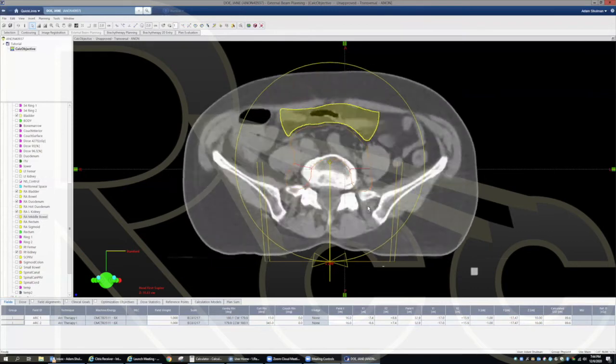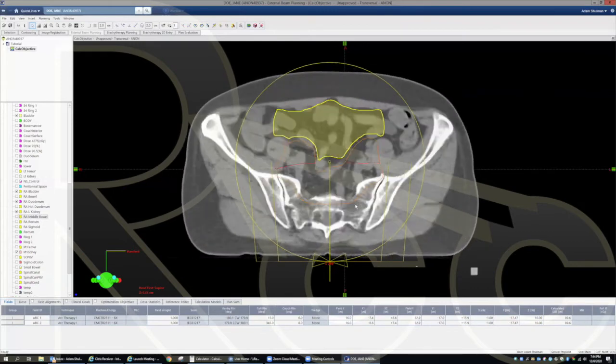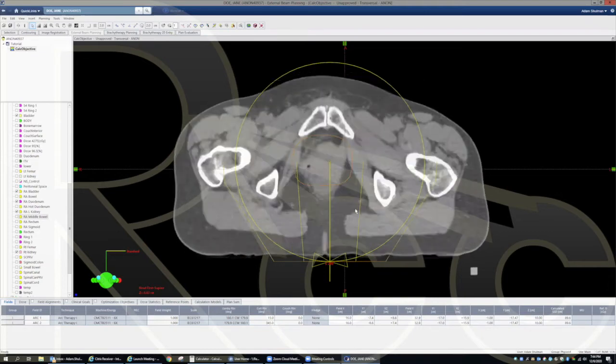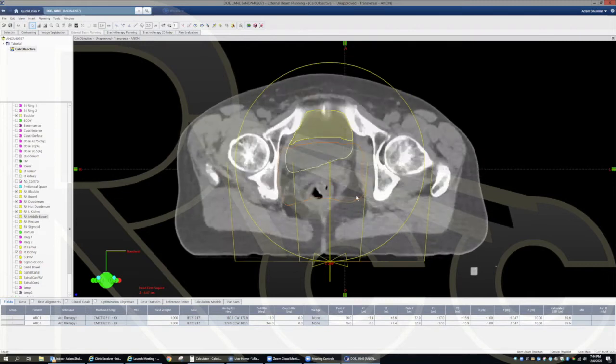The way that I'm going to show you how I plan is I'll look at my DVH constraints and see what I need to achieve, and I'll make sure that I achieve that. If there are areas of overlap or things that I can't achieve, I'll make note of that. But if I reach tolerance, I don't just stop there. What you'll see is I'll push as much as the optimizer will allow me to push. Even in this case, it's going to a lower dose, 45 gray.